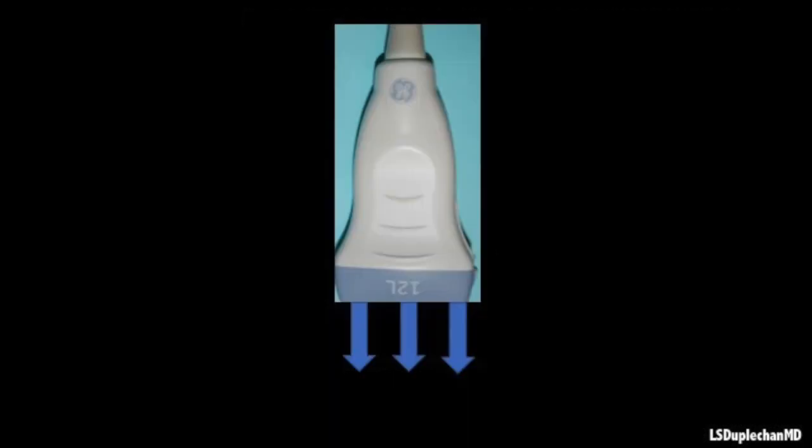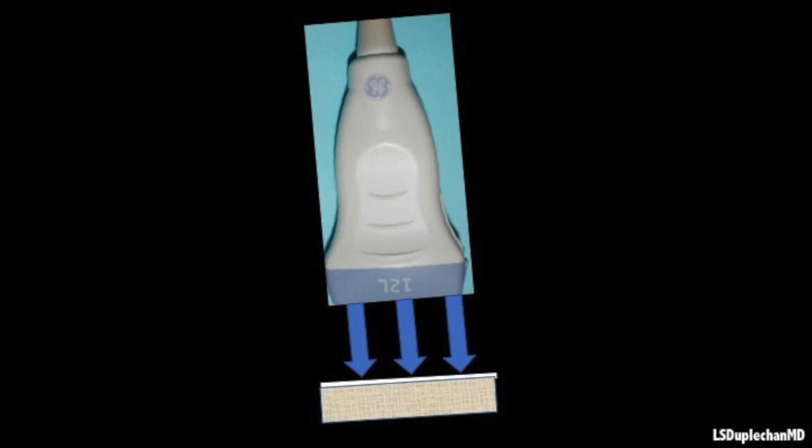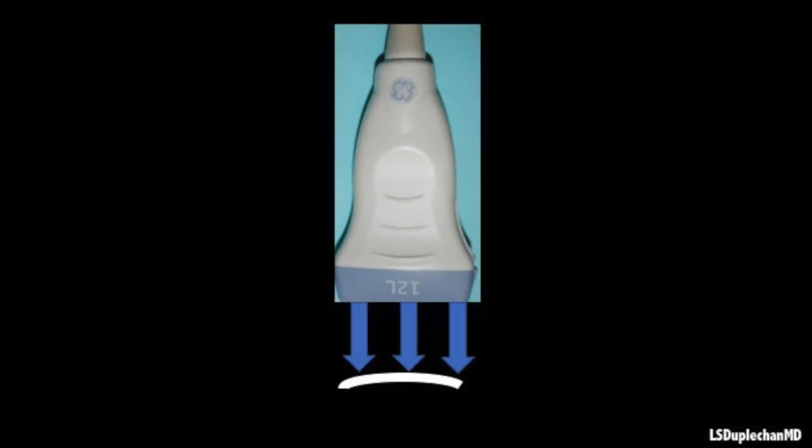This cartoon demonstrates how sound waves are reflected back to the transducer when the subject tissue is perpendicular to the sound beam and is relatively straight, depicted here as a long axis view of a long bone. When the tissue of interest is no longer perpendicular to the sound beam or curved, the waves are refracted away from the transducer, causing the interrogated tissue to appear hypoechoic.